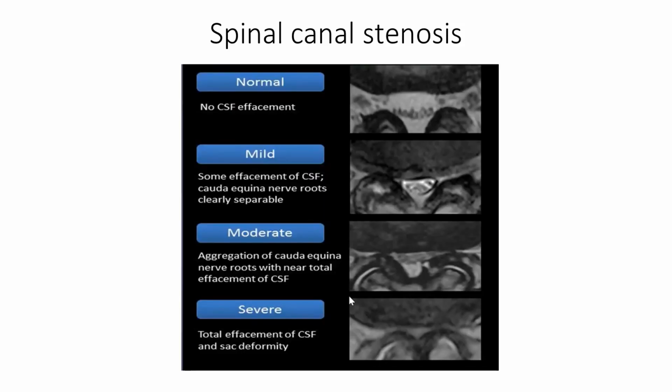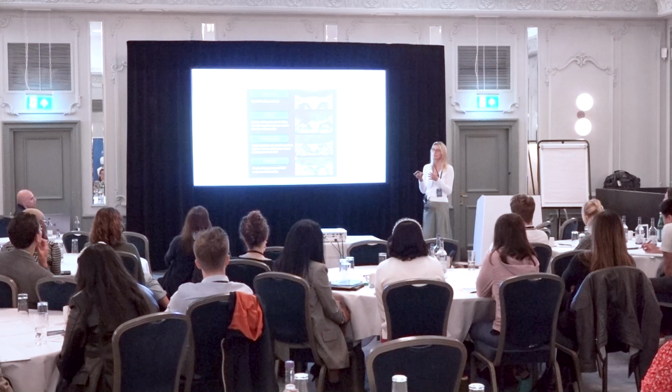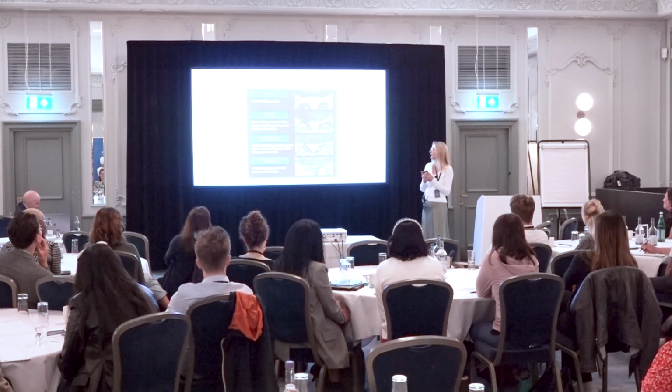And these are some pictures. I think what's important is, what I find is when you look at different radiologists, whether you're a general radiologist, a musculoskeletal radiologist, or a neuroradiologist, you will find that some people overcall stenosis, and we, as neuroradiologists, I think we tend to be more parsimonious.